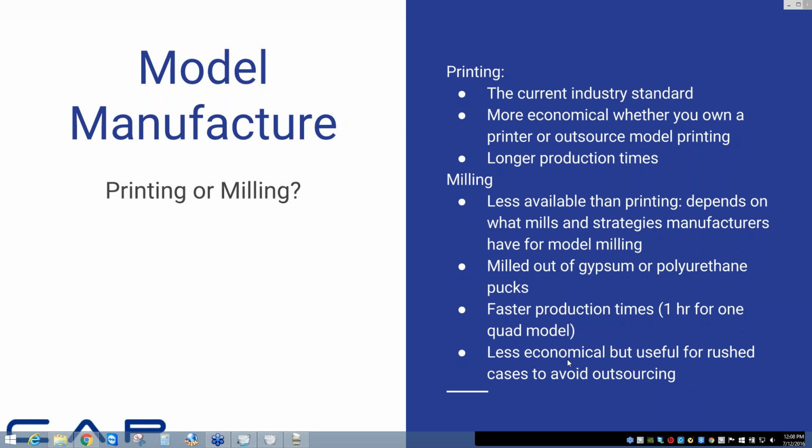I have a question regarding files that are received from PlanScan. They're saying that sometimes it didn't show them a file to import the scans when they imported the 3OXC case. Usually in that situation, that means that the 3OXC file itself never contained any scan data. You can confirm that if you have a program like 7-Zip or WinRAR. If you extract the 3OXZ file, you'll see all of the case data, and you'll be able to see the scan files themselves. So as long as you see them there, then you should be able to use those to go forward. If you don't see scan files, that means that the case the PlanScan user sent didn't have the completed scans. So that would be the sender of the file in that case.